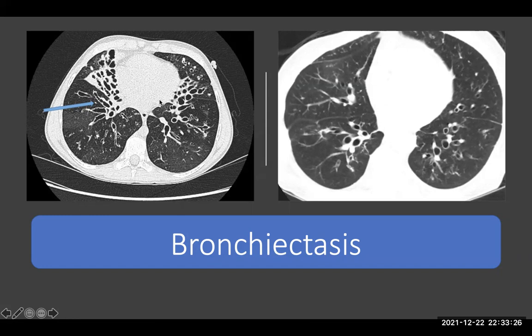We can also find some traction bronchiectasis. That means a series of dilated bronchial walls may cause this traction bronchiectasis. Importantly, always keep in mind that bronchiectatic change is most likely in the medial part of the chest. If it is in the peripheral part, then IPF or DPLD could be the differential diagnosis.